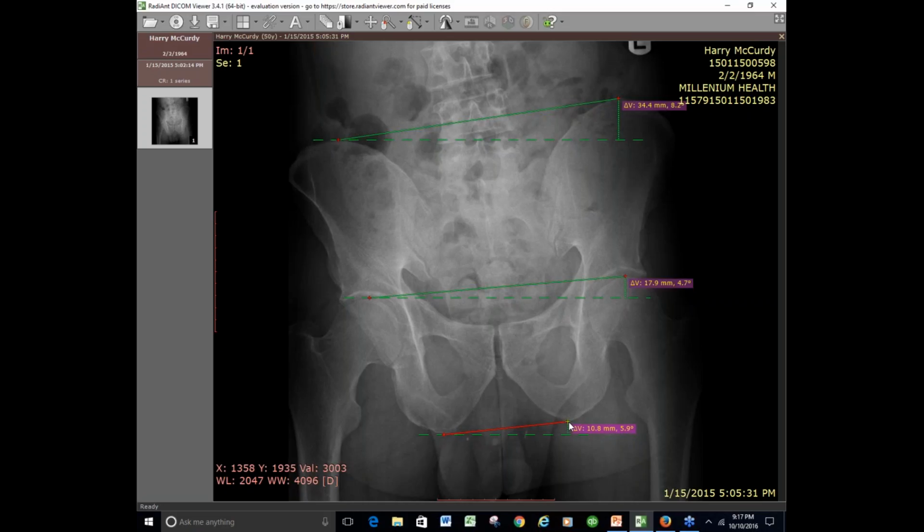Well, here's how you figure that out. You take this bottom angle and you take that 10.8 and you go straight up until you get to 8.2 degrees, right there. 15.1. It's going to take a total of 15.1 difference to make this even. But we already had 10.8.